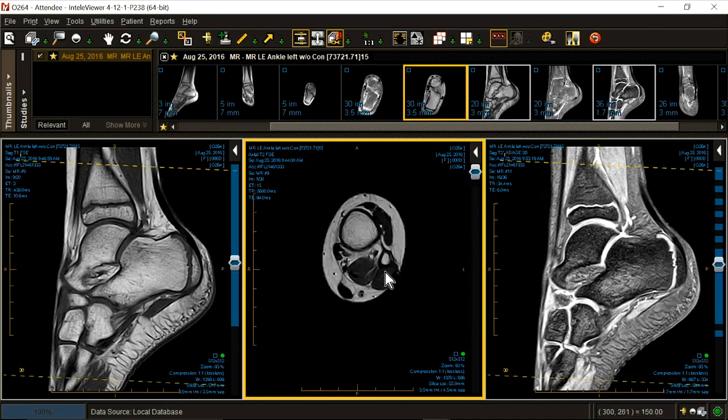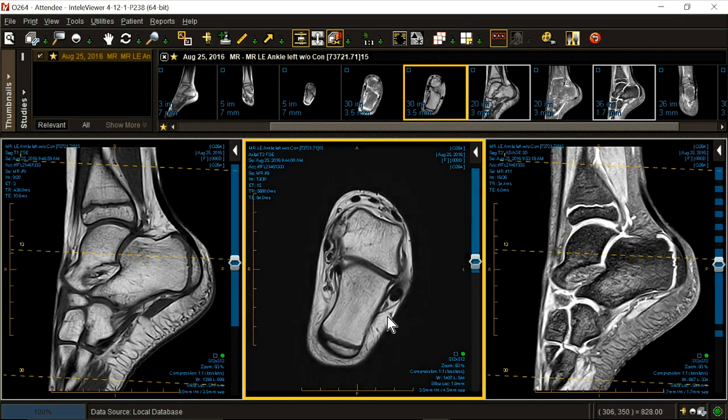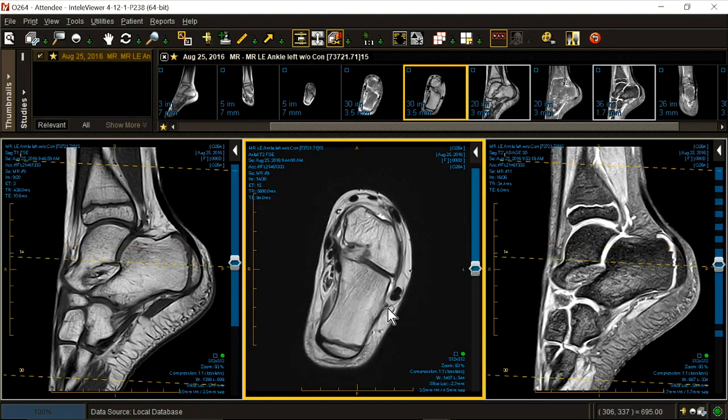Another caveat before we quit. Some of you might have noticed this, an extra structure down low. That is a muscle bundle known as a peroneocalcaneus muscle or peroneus quartus. This one attaches to the peroneal calcaneal tubercle.